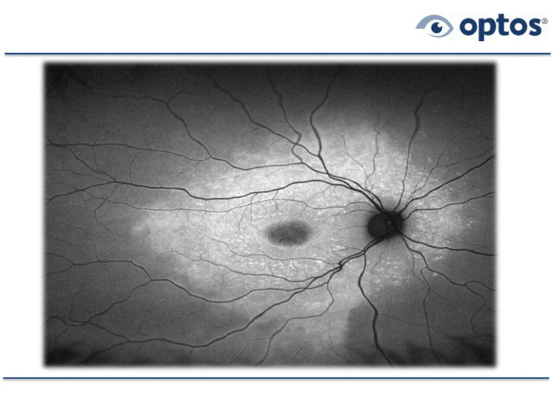The macula is dark. The oval macula is too dark, so that's hypoautofluorescent. Around it, this large area within the arcades is hyperautofluorescent. So that's retinal pigment epithelial cells that are sick or metabolically active. And you can see the spots, or the flecks, if you will. And these flecks are very, very typical of Stargardt's. Sometimes in Stargardt's, maybe a few years from now, we'll get dark flecks. In this instance, all the flecks are bright, hyperautofluorescent.